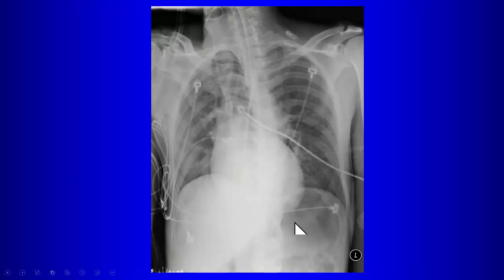Now, I've come across very few of these, and in every case that I've come across, there's been gastric distension. So what does that mean? If you have an intubated patient and you see gastric distension, please go back and look very carefully at the ET tube. 99.9% of the time it's going to be okay, but the one time in your career when you come across an esophageal intubation, please send me an email that says thank you.